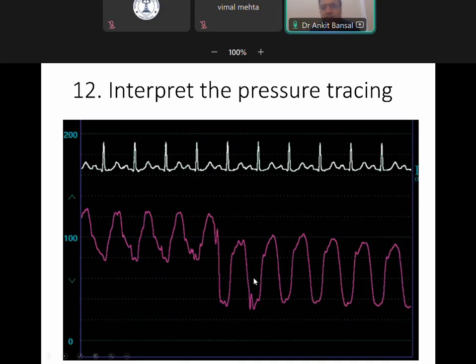Ventricularization means the wedging of the catheter into the coronary ostium when the ostial diameter is almost equal to the diameter of the catheter, and both are snugly fitting into each other. Here the flow into the coronary is obstructed and now the coronary is transmitting the LV pressures.